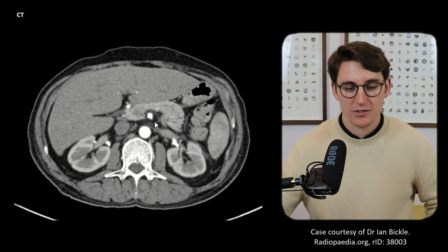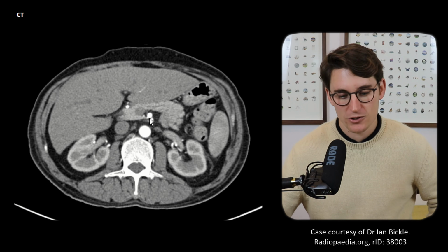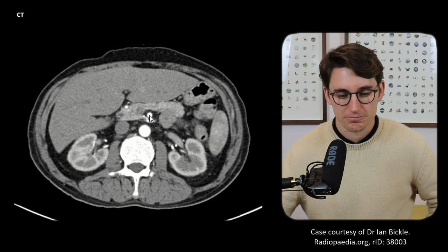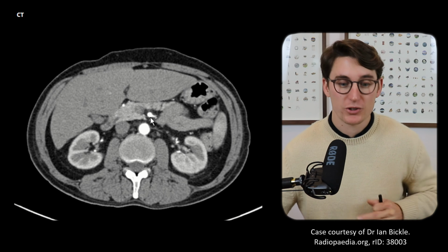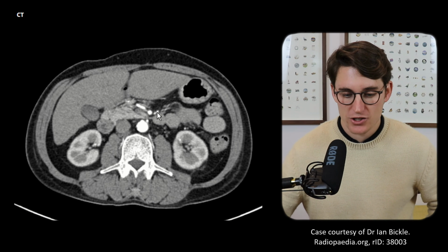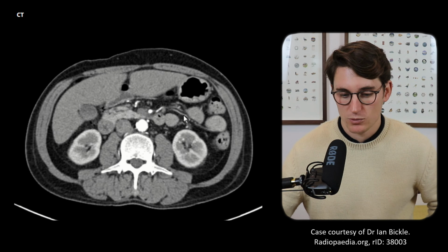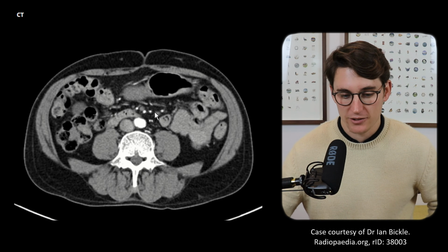And we know that just inferior to the pancreas, we're going to give off branches out. Inferior pancreatoduodenal arteries coming here. Head further on, we should now see branches coming off to the patient's left, supplying the jejunum and the ileum. So let's see the jejunal branches coming off there, going towards the jejunum. As we head down further, we see ileal branches going down.